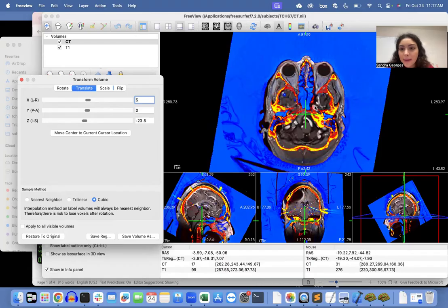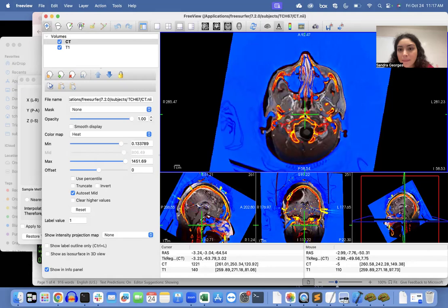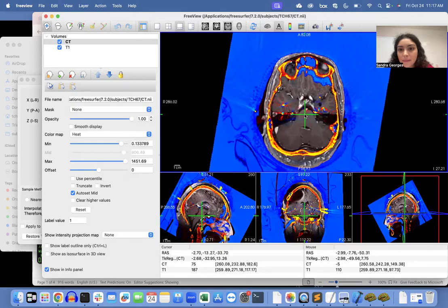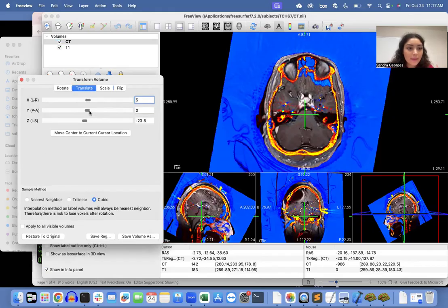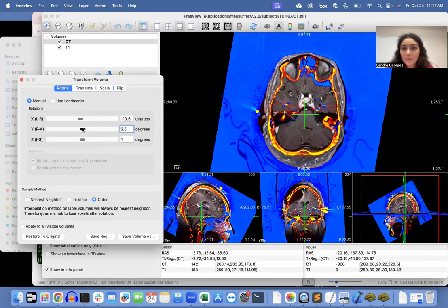Okay, it's a little bit better. This is coming in a little late, I think. So we'll go ahead and, oh, this is the wrong one.